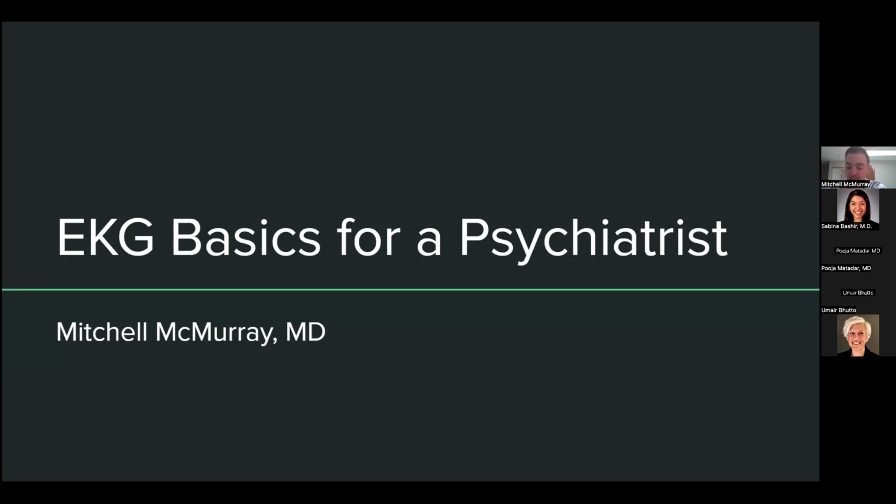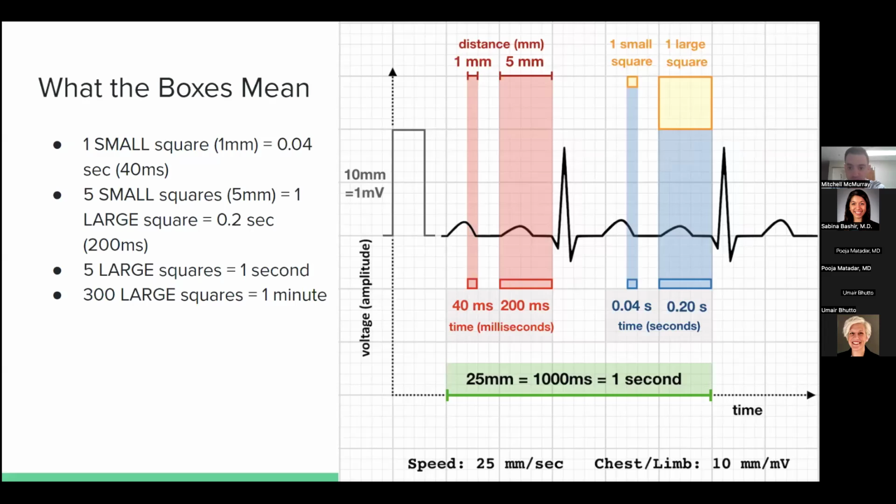Most medical schools do a pretty cursory job of going over EKGs. So I'm just going to start from the basics so that we're all on the same page and go into some little bit more complicated things and things that are going to be worthwhile for you guys to review and remember. And then the end is just a little bit of board review stuff for those that haven't taken Step 3 yet. So we'll start out with what the boxes mean.